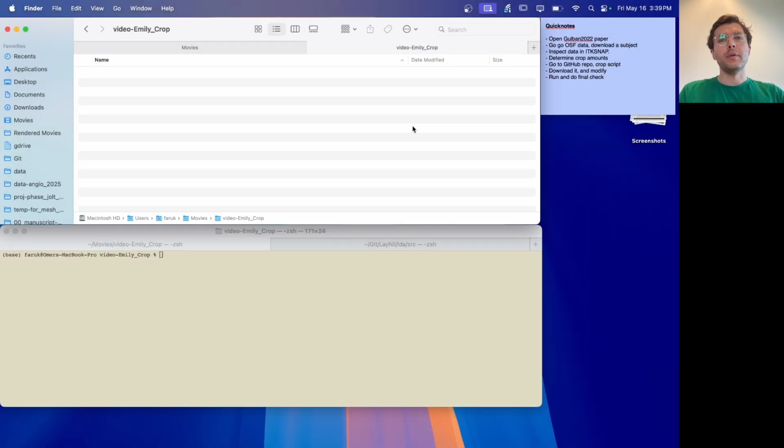Hello and welcome. Today I am going to show a very simple analysis step, namely cropping a NIfTI file that might be too large to process, or maybe you just want to focus on a single region in that file, and how to achieve it and how to process with that.